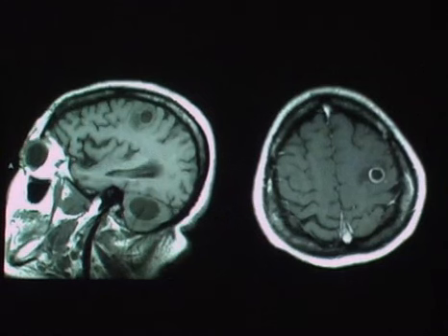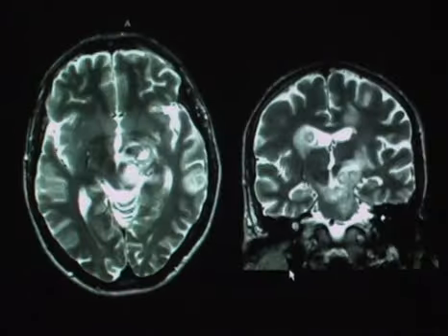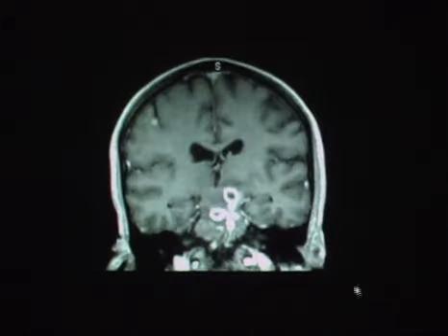Here's an example of more peripheral toxoplasma lesions, somewhat difficult to distinguish from cerebral abscesses. Here are some additional lesions seen along the right frontoparietal junction. Prominent amount of edema associated with these. Could this also be some irregular cystic metastasis? And here's an example of more of what we might see as far as the distribution of these lesions, within the midbrain and also seen in a periventricular distribution. One of the big differentials in AIDS patients for ring-enhancing or irregularly enhancing lesions within the central brain is going to be CNS lymphoma.